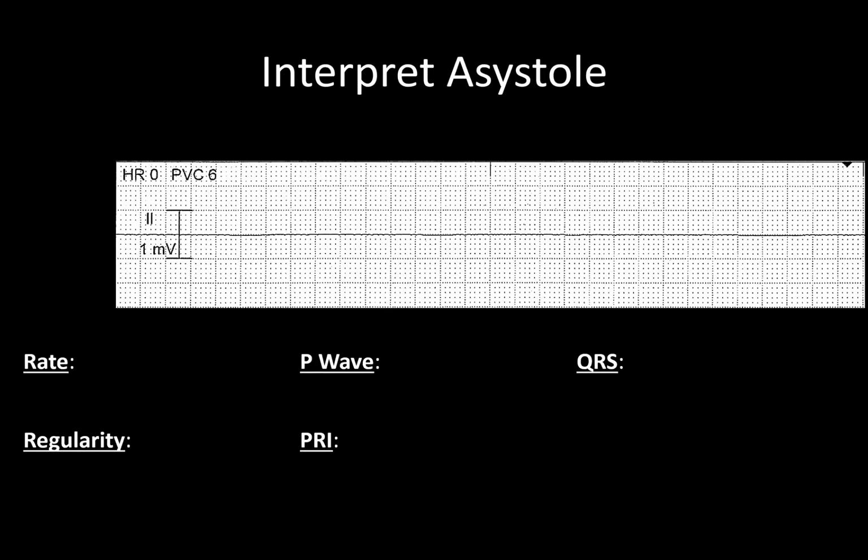I like to include this asystole one just because it's that easy to learn. But I do want you guys to realize when the leads are off or when a battery is drained on telemetry, this is all that the monitor tech sees, and that's very disconcerting. So it's important that you realize that a flat line on the screen is a scary thing. So we always want to make sure that we're evaluating this, making sure leads are on, and all the different things that we can do to help keep monitoring on our patients.